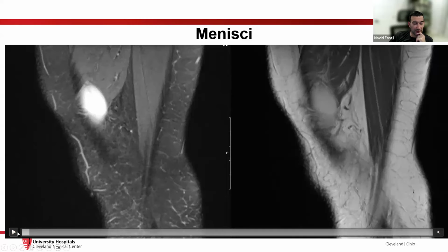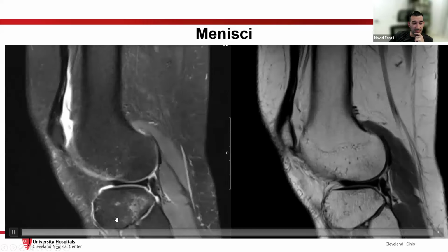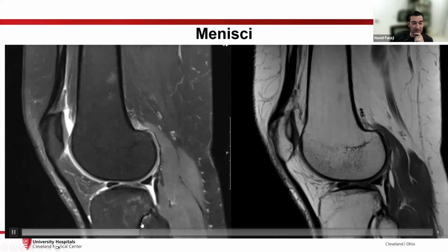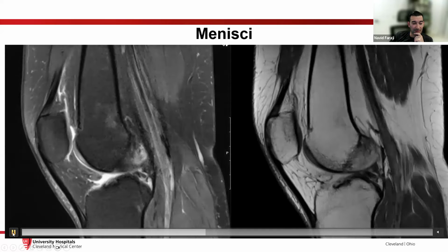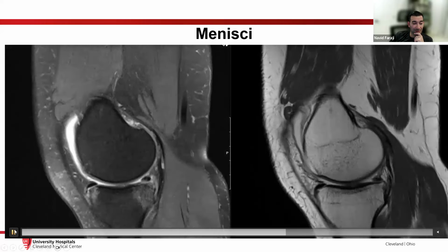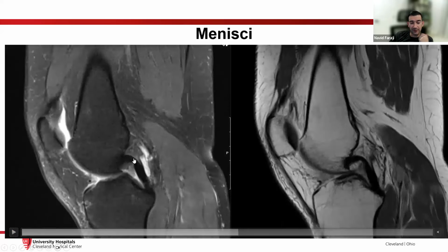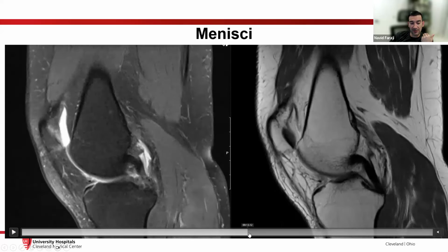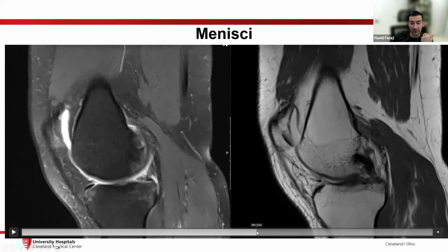So let's see that again. A different case of meniscal pathology. And this is one of the more commonly missed meniscal tears, if I think I put the right one in. So let me just show you here. Okay, so the key here is this. Here's your PCL. If we're going from lateral to medial, your first slice as you exit the PCL, you should see a medial meniscus posterior root. Okay, there should be a triangular posterior root here.